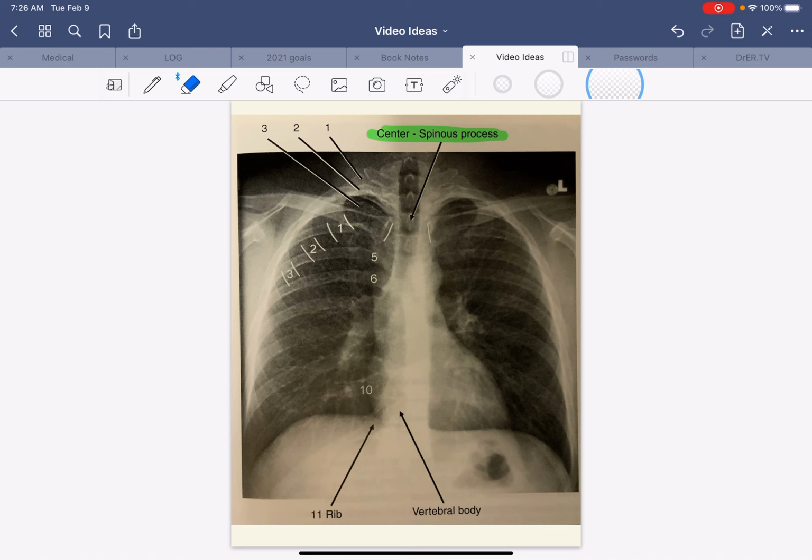The other thing is bones. You should be able to see the ribs. You should be able to see shoulders and vertebral column. So shoulders here, a little bit of them anyway. And the lungs, you should be seeing that the lungs are symmetric. You can see the angle. So here you kind of lose that angle. It should have been caught, because what if there's something right there and you miss a little pleural effusion, a tiny little pneumonia or something. So you want to make sure all the angles of the lungs are visualized. You can follow these lines all the way through.